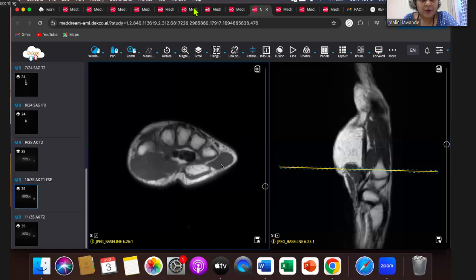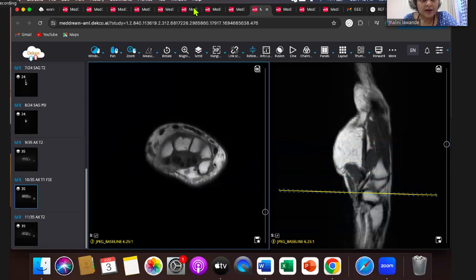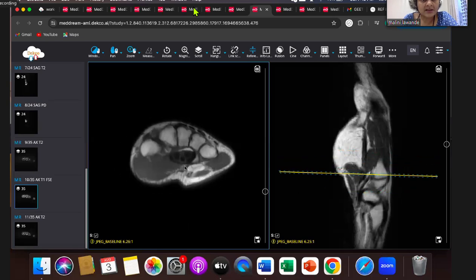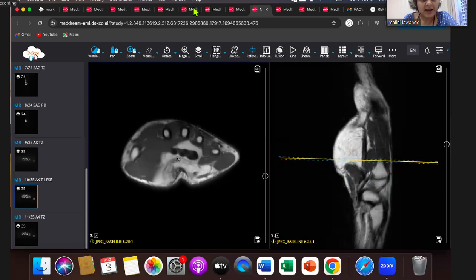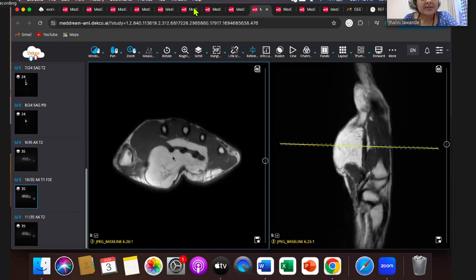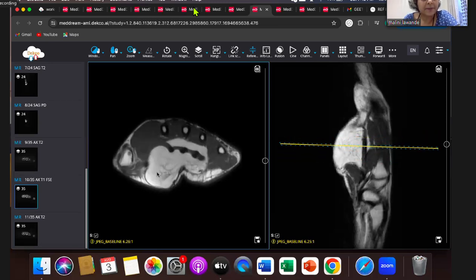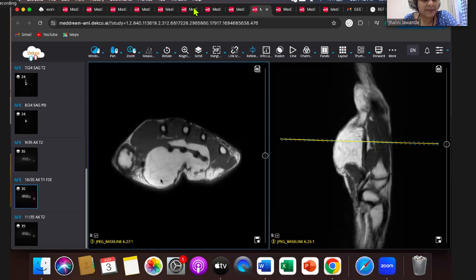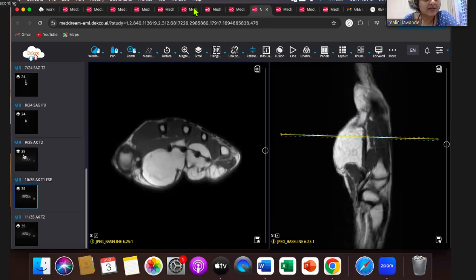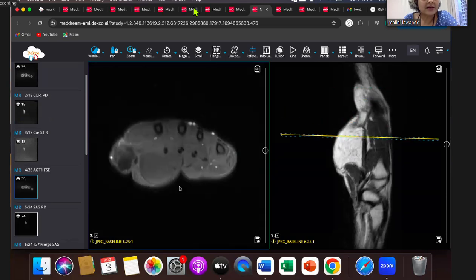First, we are thinking of fibrolipomatous hamartoma of median nerve. That was a question. But if we look at it, the median nerve is compressed. You can see the median nerve here, and it is fully compressed by the lesion. Second thing is, this particular lesion is infiltrating both deep as well as superficial to the tendons. There is this very flimsy, thin septae-like appearance. But on FATSAT T1 weighted images, it is getting homogeneously suppressed.